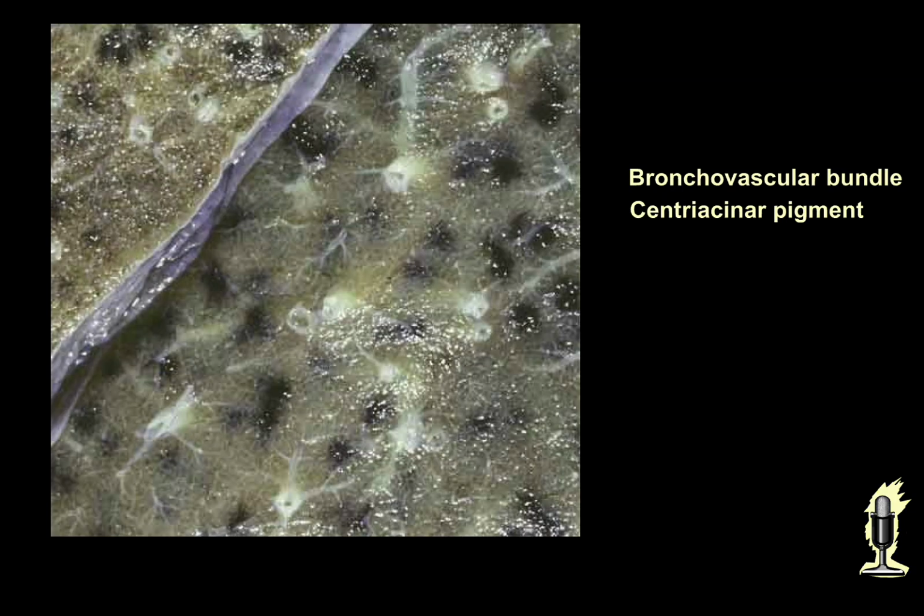Remember, the airspace nodules of EG, which is due to cigarette smoking, or the airspace nodules of hypersensitivity pneumonitis and coal worker's pneumoconiosis, which are due to inhaled dusts, are similar in that the dust particles deposit in the respiratory bronchioles in the centri-acinar portion of the lobule. This is the same location as the deposition of anthracotic pigment as seen in this pathologic specimen.